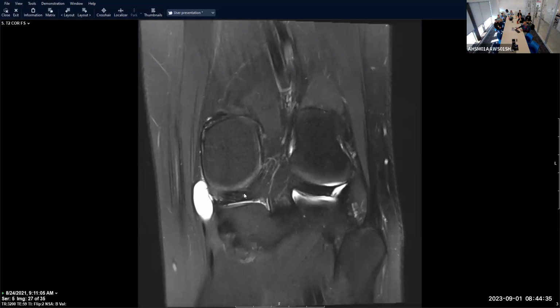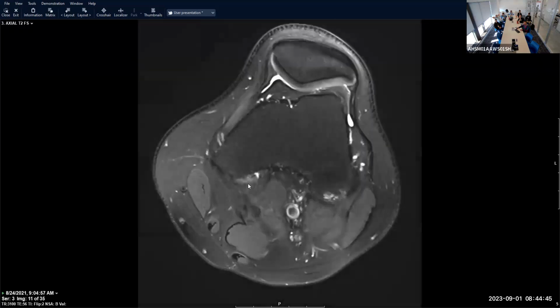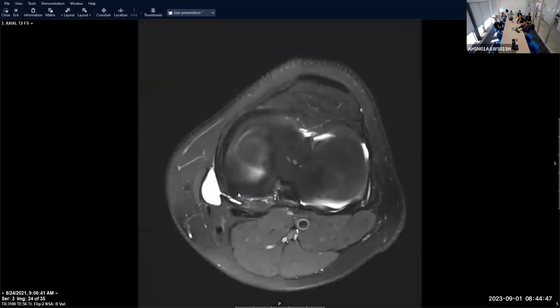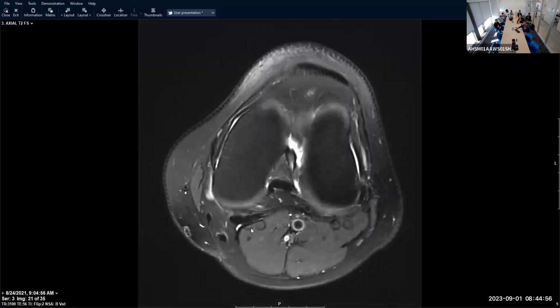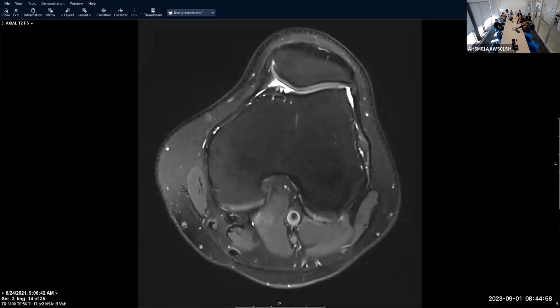That's what we're seeing here, and the tear is probably further out in the posterior horn as we were seeing on the sagittal plane, but it's propagating with this multi-loculated stalk to the posterior medial aspect of the knee. And that's a parameniscal cyst. Again, it can be a secondary sign to help us identify more subtle meniscal tears. It's distinct from this little trace popliteal cyst, which I would ignore if I was interpreting this exam.